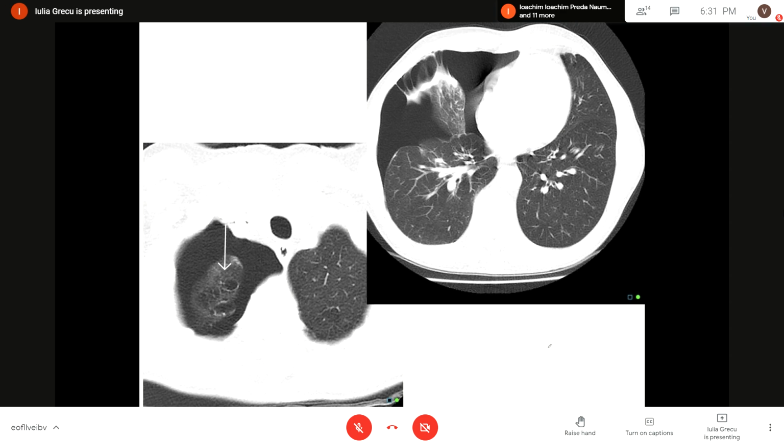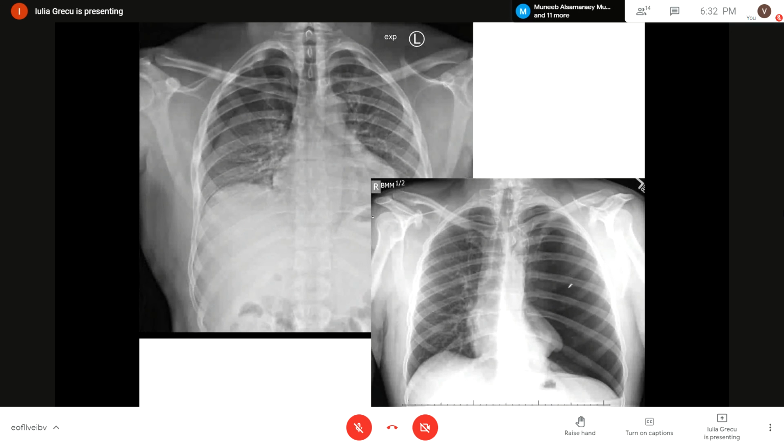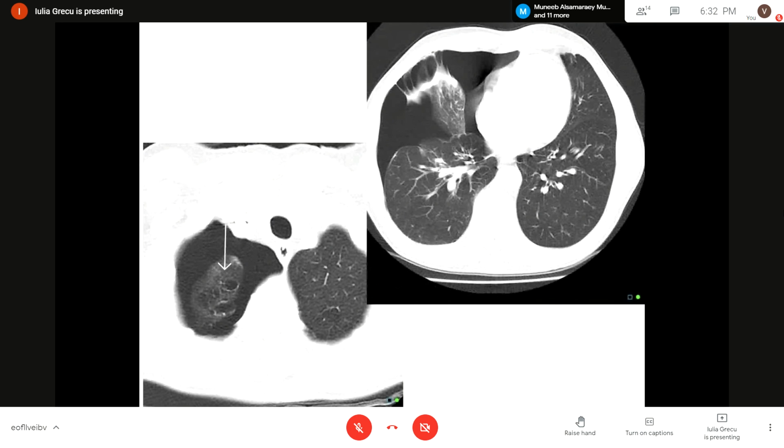Okay, these are examples of chest CTs. They are viewed in a pulmonary window. You can see very nicely the lung parenchyma, and here, similar to the aspects in the chest X-ray, you see hyperlucency with no vascular margins.